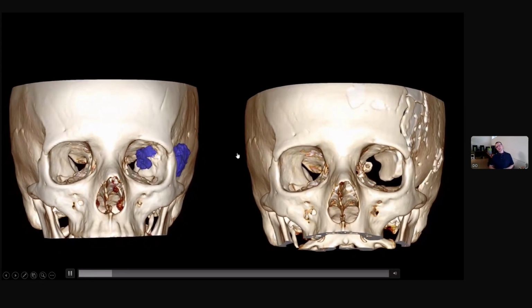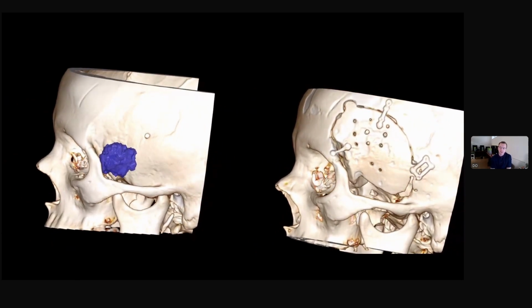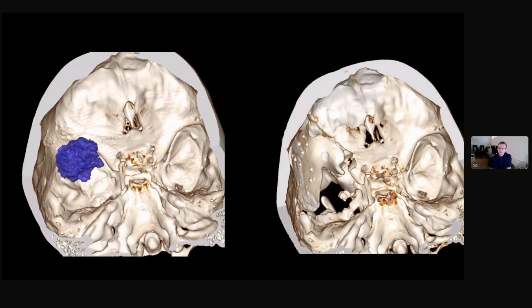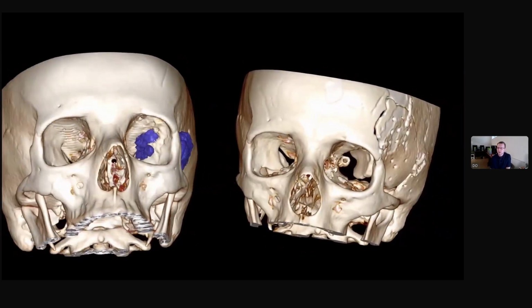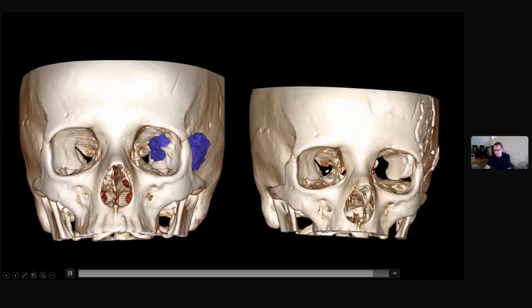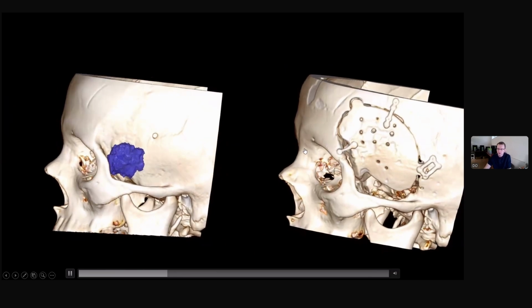For this case, the resection of hyperostosis was performed using a surgical guide, and after that, in the same anesthesia, which is important, this individual implant was placed using a metamold and fixed with titanium plates and screws. You can see that this implant consists of a convexital part with elements of the lateral wall of the orbit and the orbital roof.